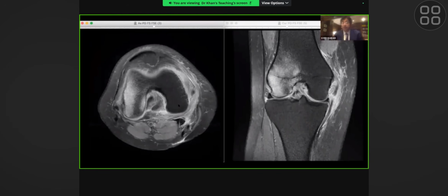And there is no patella dislocation. This is a relevant negative that you're giving, that there's no patella dislocation. And most importantly, there is complete disruption of the PCL. So how do you treat PCL disruptions? Generally speaking, unless it's a bony avulsion, they tend to heal. So it's unlike ACL where you have to go in and do intervention. This generally tends to heal and scars and actually functions pretty well. But if it's an avulsion injury, then you have to go and fix that. Okay. So that's case 2.